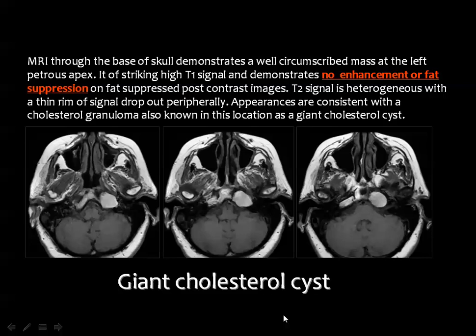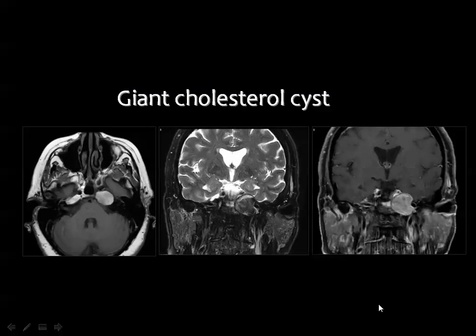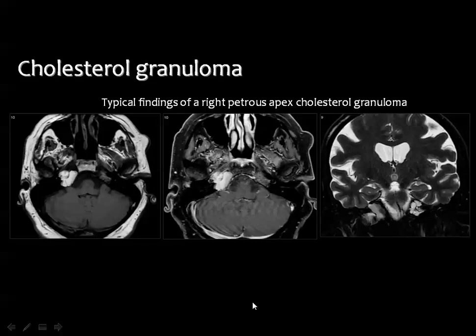And this is another example showing the lesion at the apex of the left Petrous bone with evident high signal intensity in this T1 weighted image. In the T2 weighted image, you can see some drop of the signal intensity, and in the T1 fat suppressed image, usually you do not see suppression of the cholesterol within this cholesterol cyst or cholesterol granuloma.